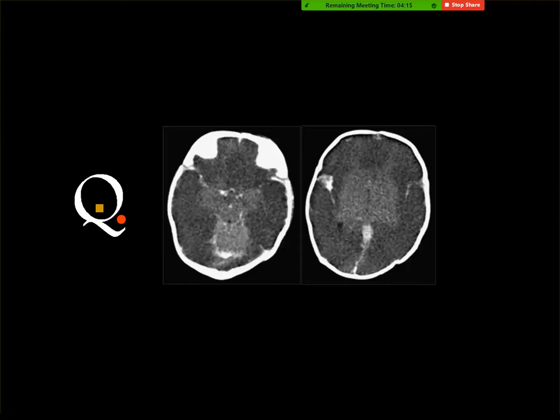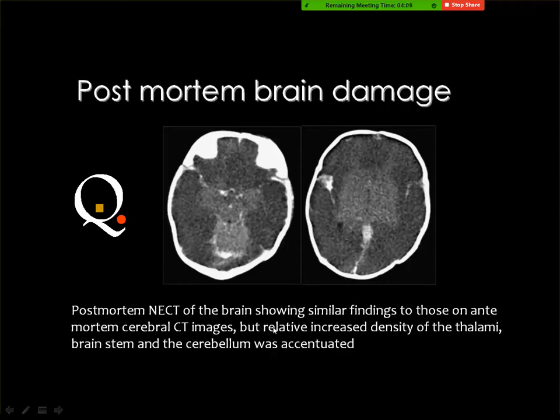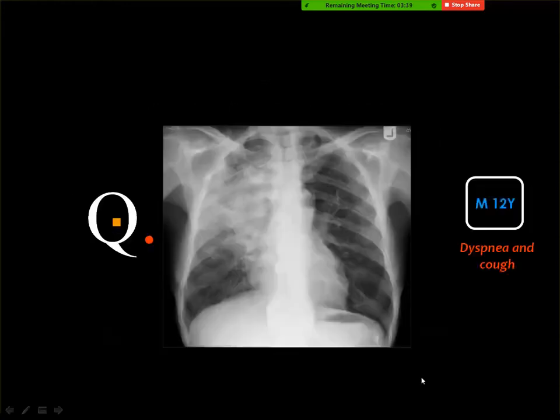Hypoxic ischemic encephalopathy. Yes, and this is hypoxic ischemic encephalopathy with profound ischemia. And you know that it is profound by the presence of multiple hemorrhages, which means that the vessels feeding the wall of the arteries are also affected. Then the arteries are damaged and they bleed. And whenever you see this, you know that this patient is about to die or even is dead as well. Okay.